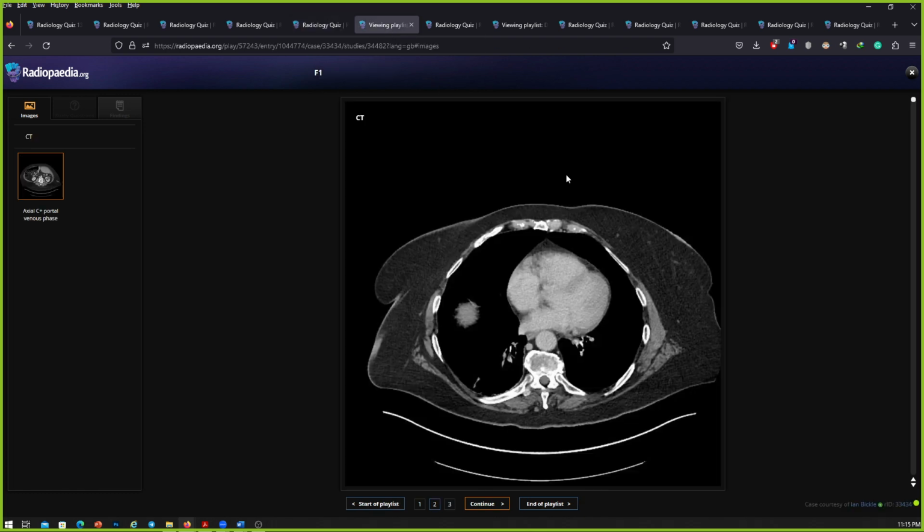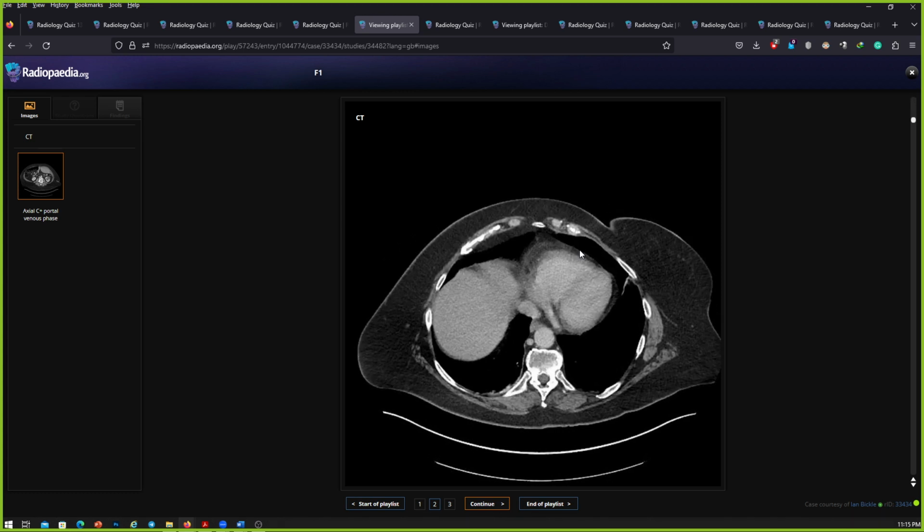Okay. You will have to scroll through this case. Go ahead. Okay.